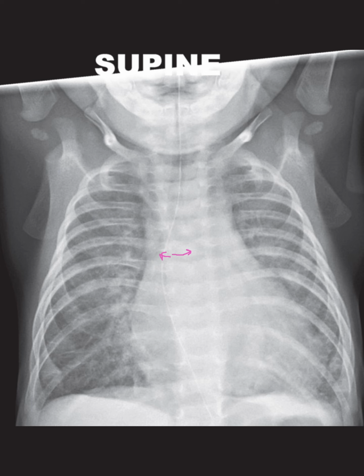In terms of left atrial enlargement, which we see here, it can manifest in several ways on a plain film. Splaying of the carina is a classical sign. In this case, the nasogastric tube displacement to the right is a helpful marker. You might also see a double density sign through the right upper heart border. Chronic mitral regurgitation and stenosis can cause these changes, leading to left ventricular enlargement due to increased diastolic volume. In cases of stenosis, the left ventricle isn't enlarged, and the aorta might be smaller.